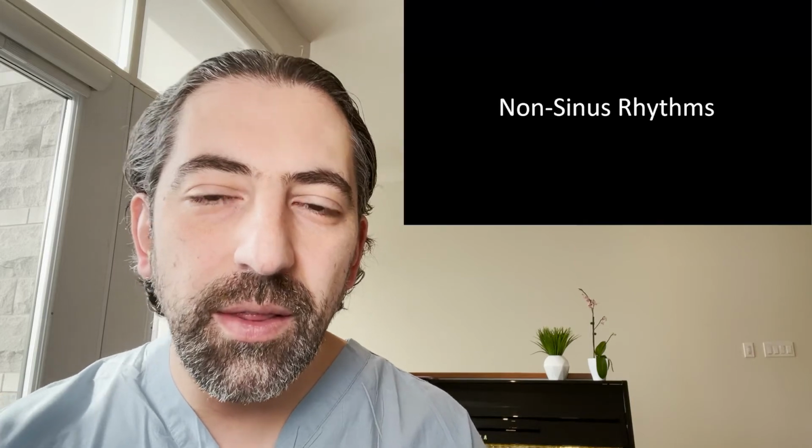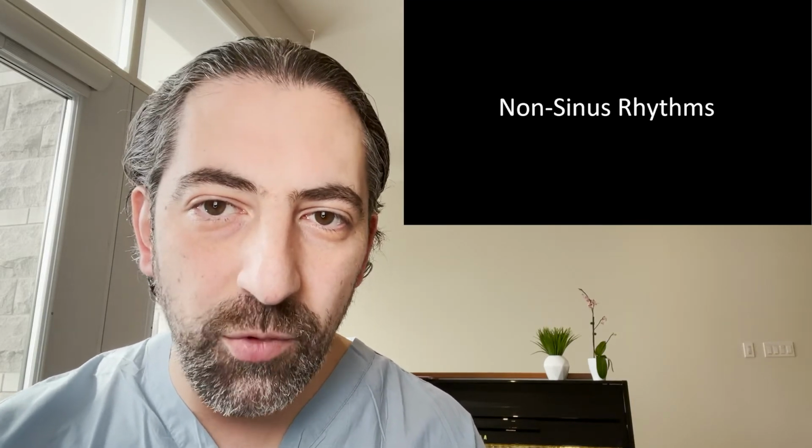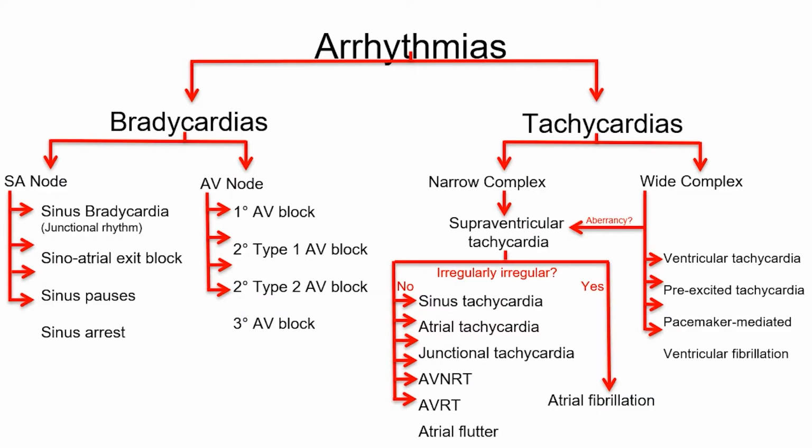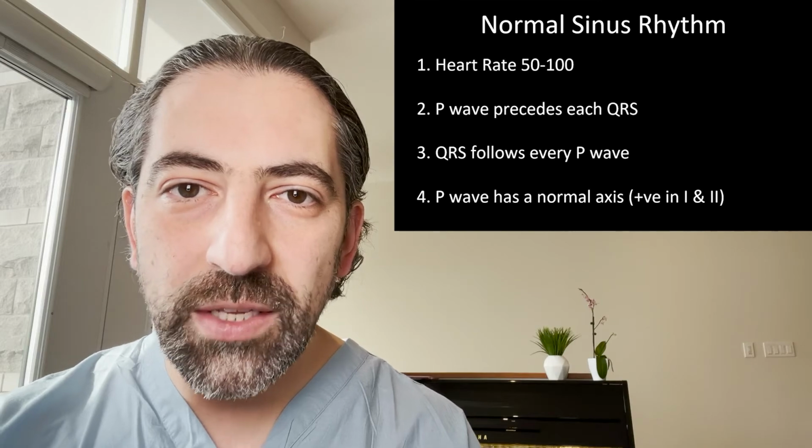Now we've discussed what normal sinus rhythm is. We've discussed different variants of sinus rhythm. There are also many arrhythmias in the heart that do not originate from the sinus node and are abnormal. This slide shows some of these arrhythmias. We will be discussing all of them in the upcoming lectures. However, for now, I wanted to make sure that everybody knows what normal sinus rhythm is and different variants of sinus rhythm.